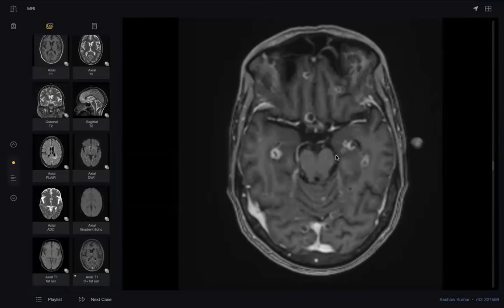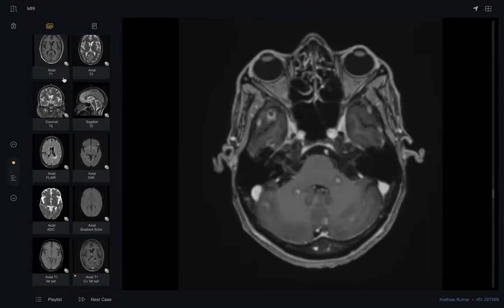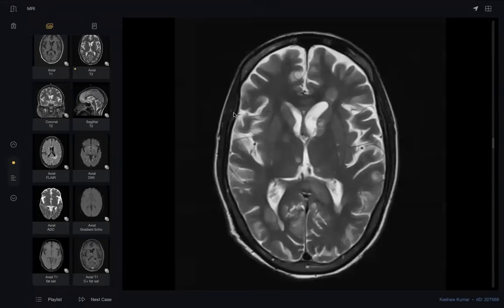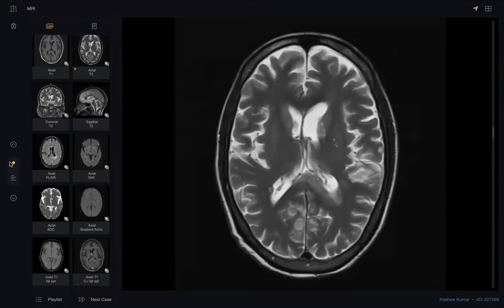During your discussion, you must tell the examiner, is this patient immunocompromised? This is very important. Why? Because it is very endemic in the UK. It is very important in the consequences, either in the diagnostic or the management. So this question is very critical. Why? Many HIV patients may be discovered for the first time after this MRI. Very important. By the way, anyone know how to differentiate between tuberculous abscess and tuberculoma?